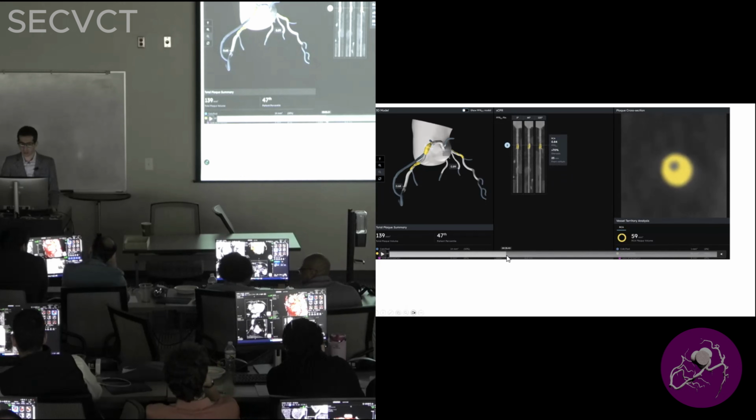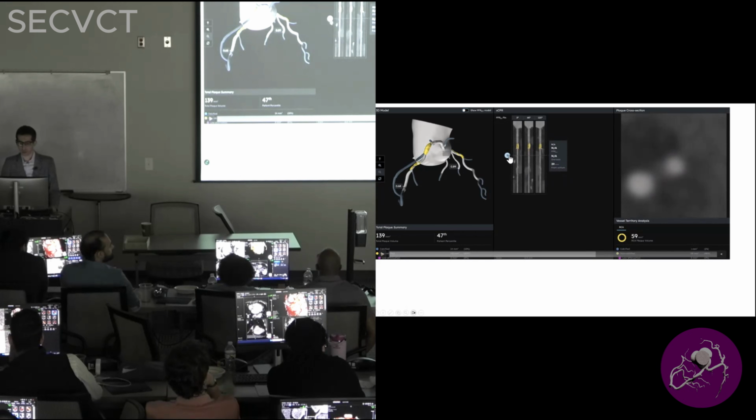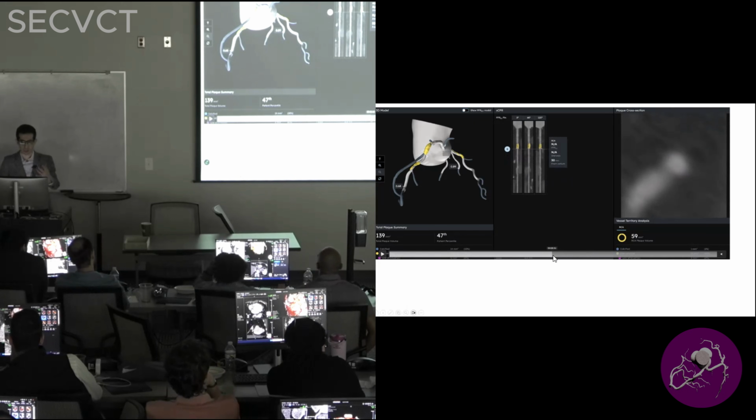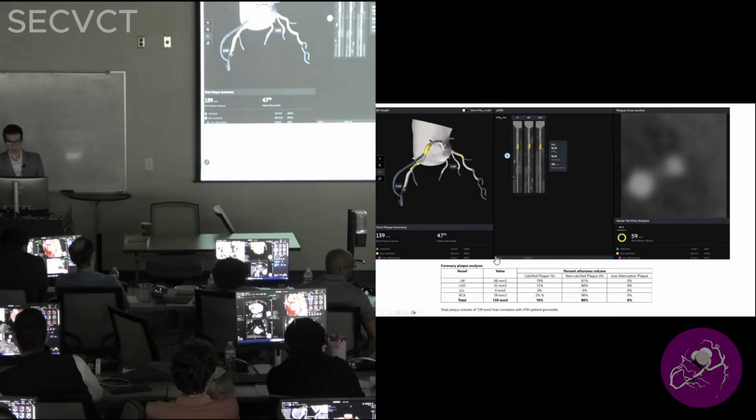And I think this is a good tool. One, you understand how the artery is pathologic, how long, but also it gives you an understanding of how far it is from the ostium. So if you look here carefully, you see the number it gives you. This lesion was about 30 millimeters, so 3 centimeters from the ostium. Sometimes for our interventional colleagues, we tell them where the lesion is, and it's really good technology nowadays.